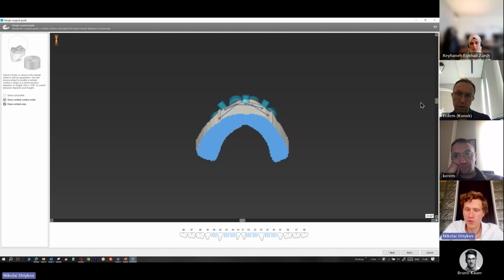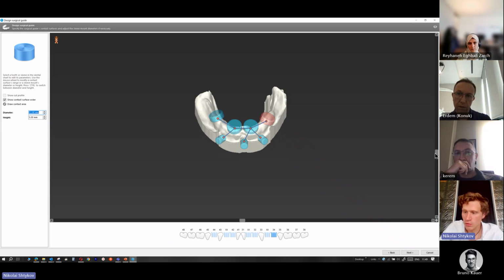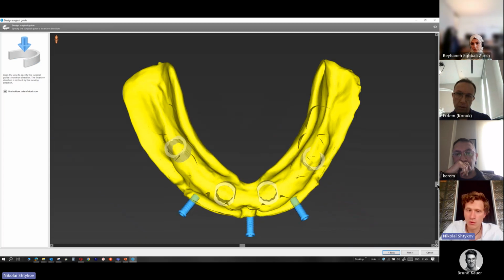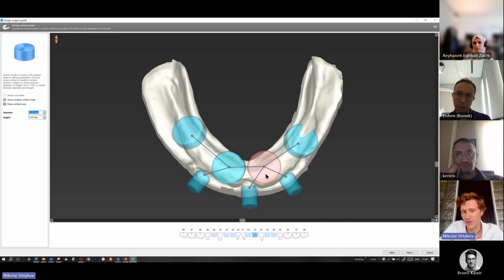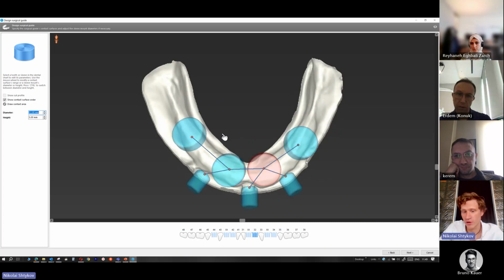Here you can see like a model. I see some artifacts. I go back, and this area, that's why I removed the spots, because spots will be placed here, and on this model we could have the artifacts. That's why I remove it. I don't need the implants in this case, and I remove it.